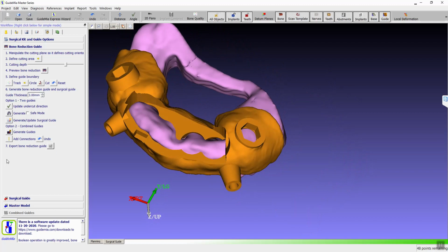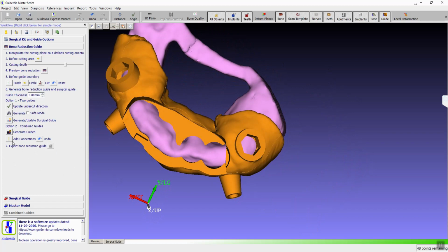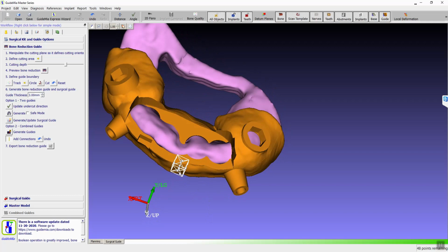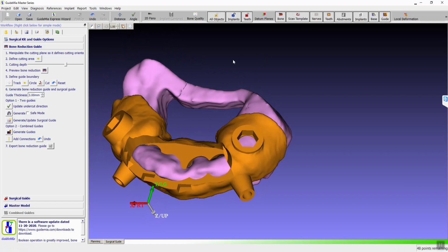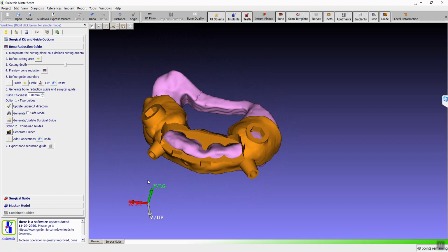It took me a while to figure out. You click the button a second time to finish, execute the cut. Okay, so we do the same thing here. Let's see why it doesn't go to the right place the first time. Okay, let's say we are doing that. We finish the cutting. So that's how we create the feature for you to place the second guide. So let's say if we don't want to create anything on the back, then we are done with this.